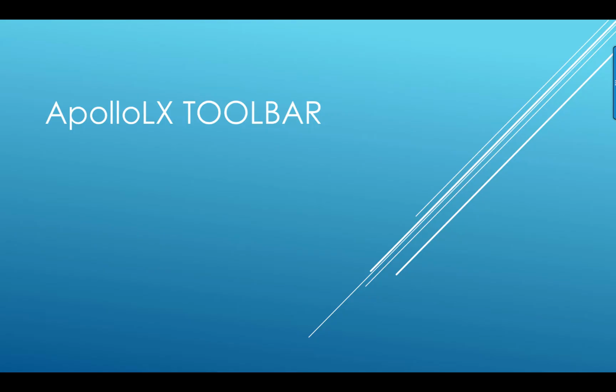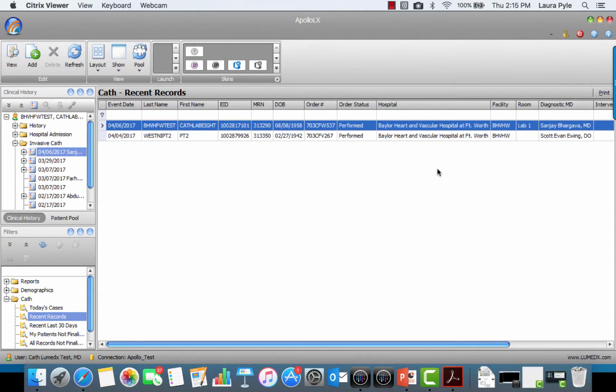ApolloLX Toolbar. The ApolloLX Toolbar is at the top of your screen. The toolbar icons will change depending on whether or not you are within a patient record. I will address a few of the icons on the ApolloLX Toolbar. View. If you click the View icon, it will open the patient event record that you have highlighted in the patient list.